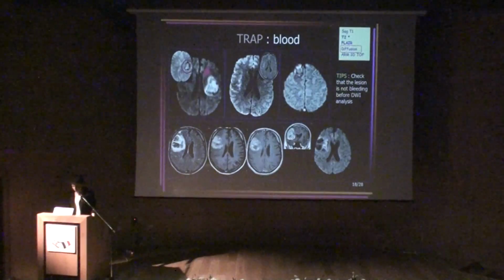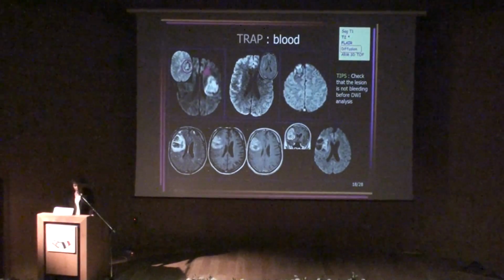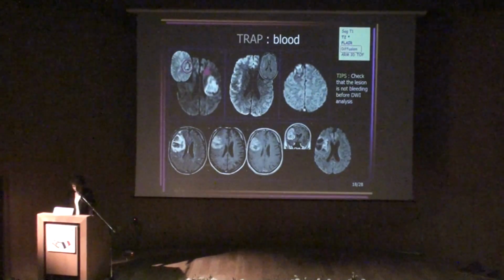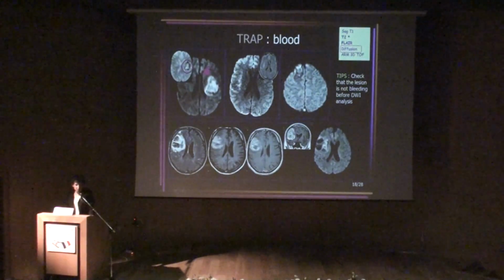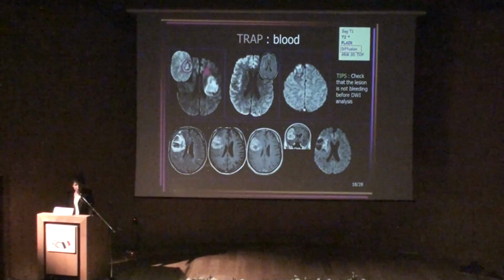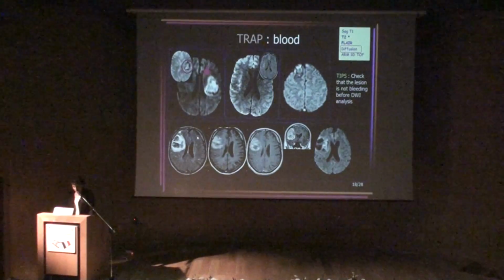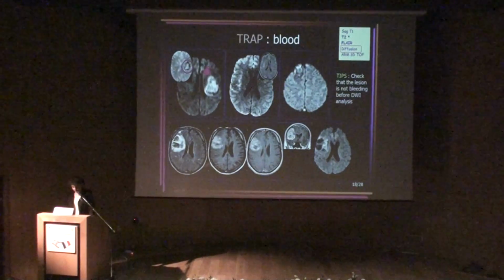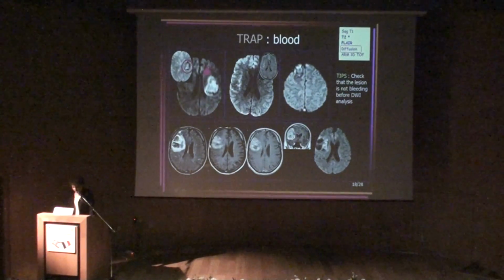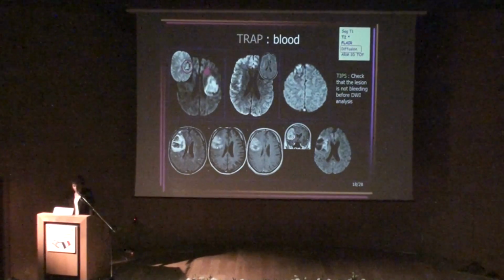And here I'll try to convince you to be careful of blood products by this example where we made a big mistake. The situation was the following. We had a CT scan showing a hemorrhagic lesion. The patient had lost 20 to 15 kilos in 3 months. And we looked at the FLAIR. We saw some blood product and some edema. Here is compatible with some blood.